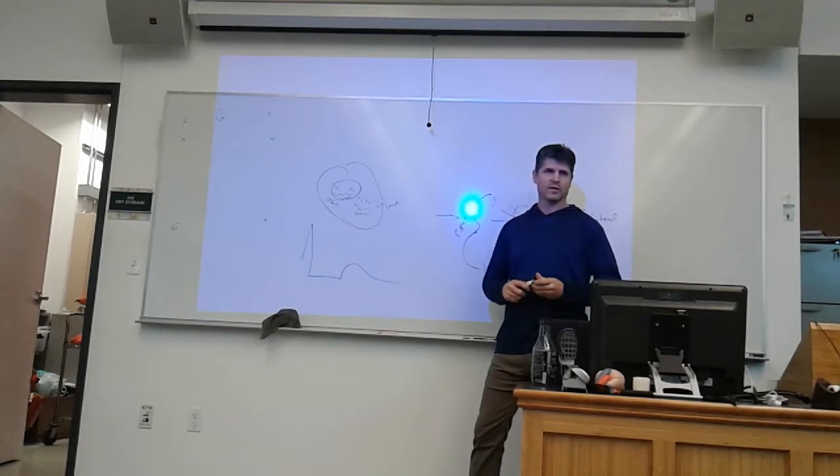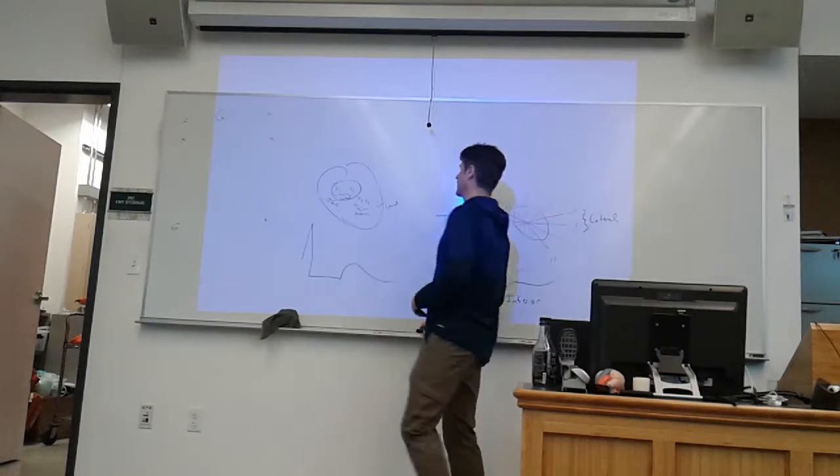Does that make sense so far? Okay, so some things to look at.